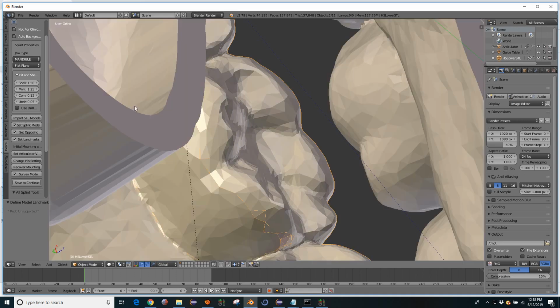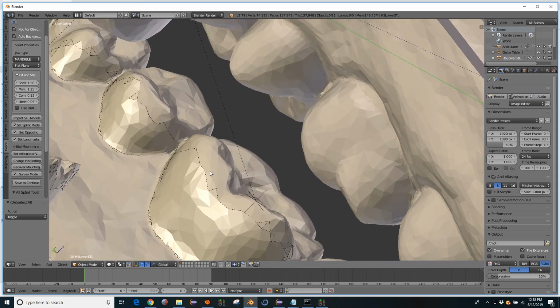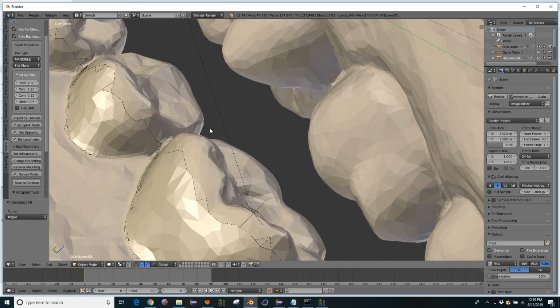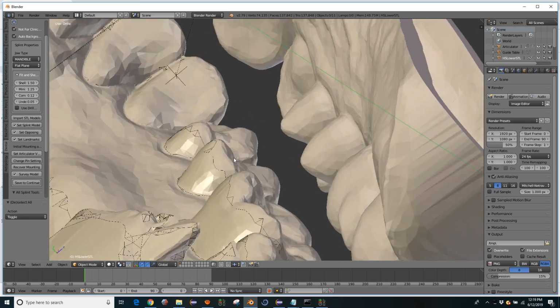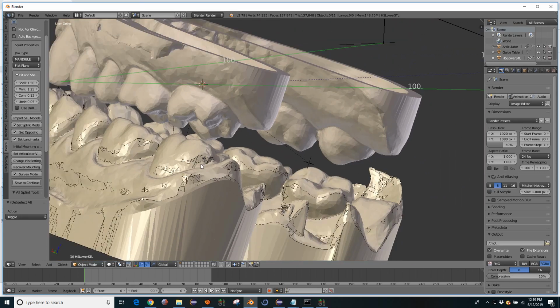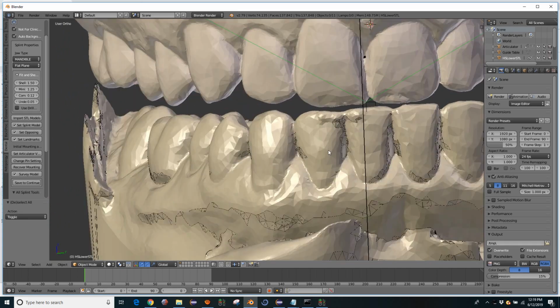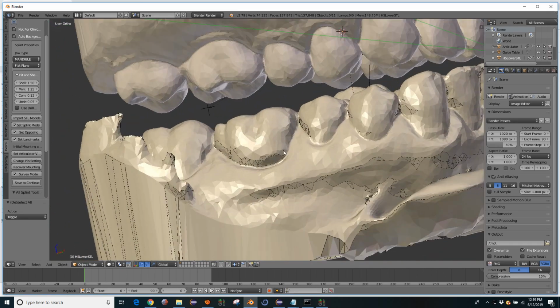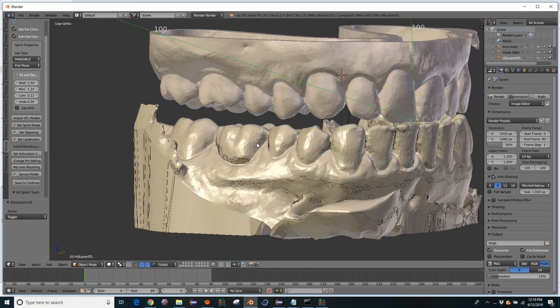And so when you find all the edges that have one face facing towards and one face facing away, even if just by a little bit, you found the height of contour. Okay. In a lower res model like this, it's not as precise, although this is fine for making of splints. In a little higher res model, that line can actually be very precise.